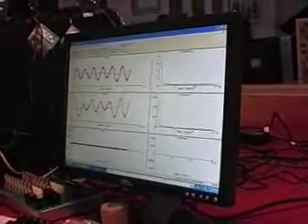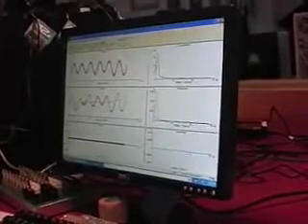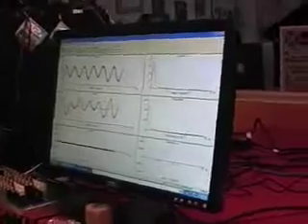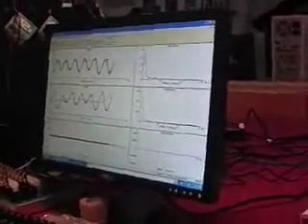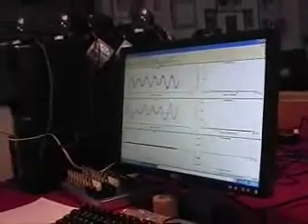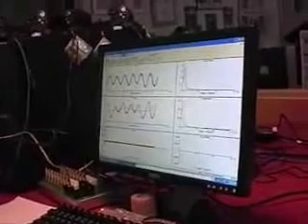I said I want to do it at point 2. There's point 2, point 2. You see how it's over smooth if you don't put it. Point 2. Well, you can just do that manually anyway. Yes. It takes 2 seconds to do. No, it's working automatically too. Just something was wrong.